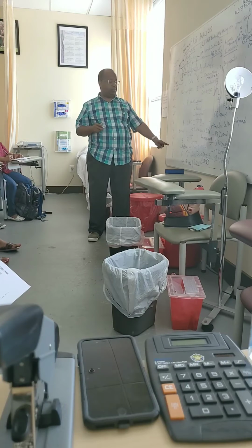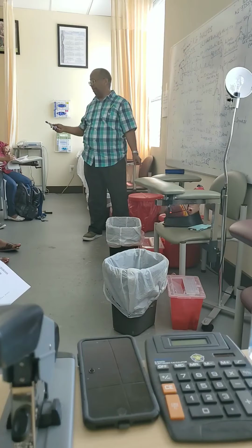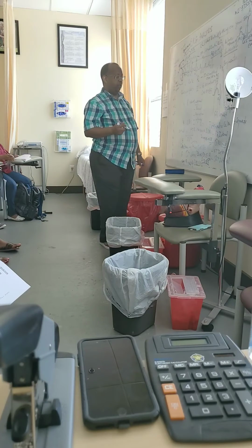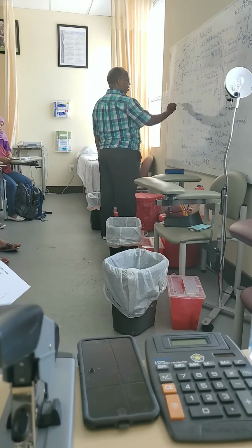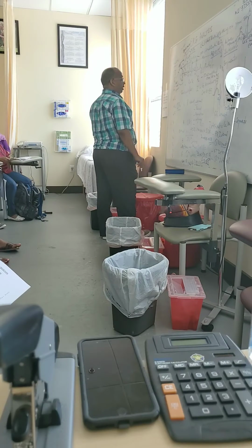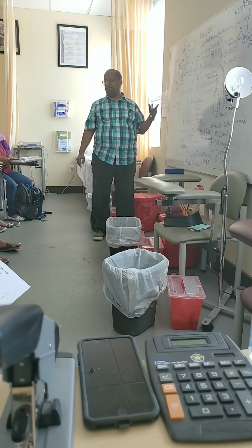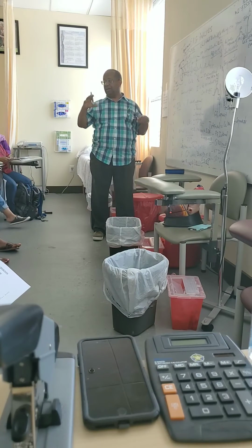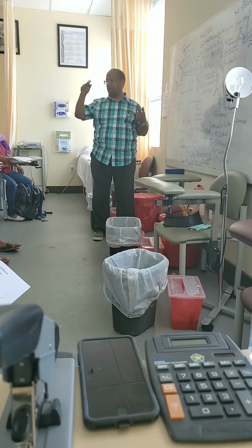And after this, you can correct the QT. There is what's called QTc, the QT correction. After you get QT, you can use a formula online. There is also a hand formula, but that's a little bit difficult. You need to use a square root and so on.